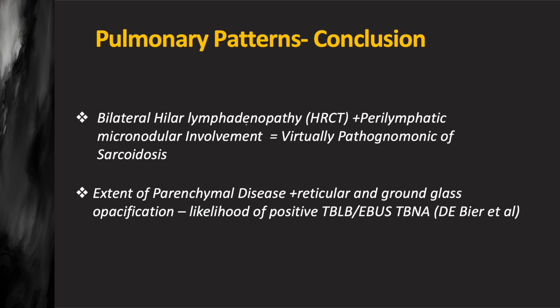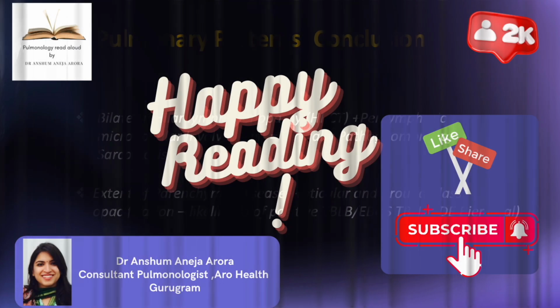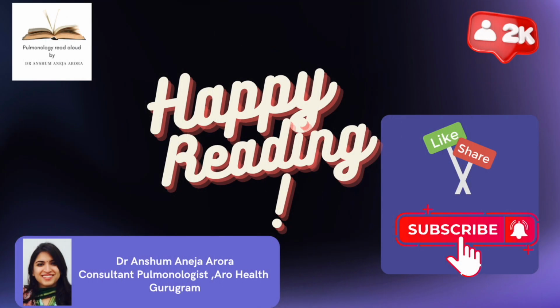The extent of parenchymal disease involvement, the reticular opacities, the ground glassing, they all are important to ascertain what the likelihood would be that we will get the diagnosis on testing. So when we're planning TBLB, or endobronchial ultrasound guided needle aspiration, the CT scan plays a very, very important role. So this is all from Pulmonology Read Aloud today.